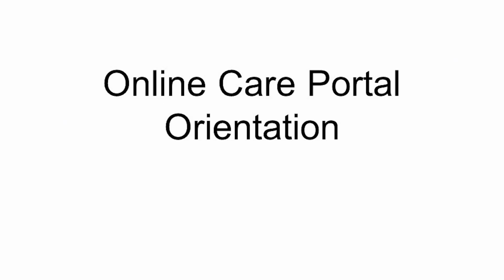The online care portal orientation. Aside from the touchscreen, which we were oriented to last week, there is another piece of GrandCare technology known as the online care portal.